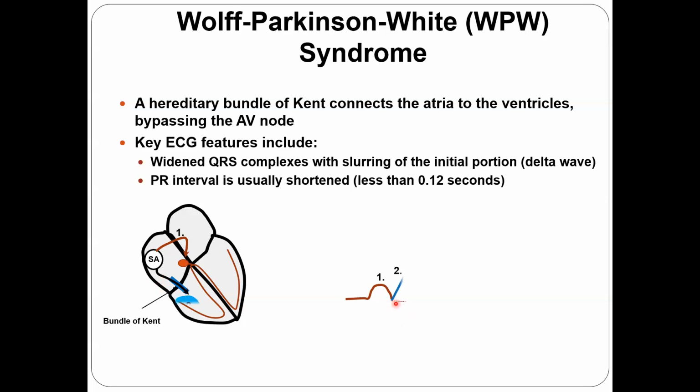This is why, the dotted line means the AV conducting charge, and the blue one is the muscle type conduction. What you do see, the PR is short. Right after the P, a ventricle activation starts. So the QRS is getting wider. And the first part of the QRS looks like a delta wave, as you do have.